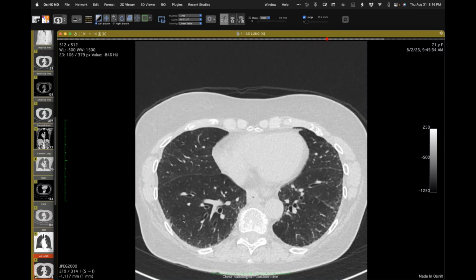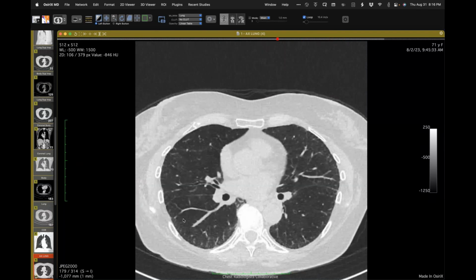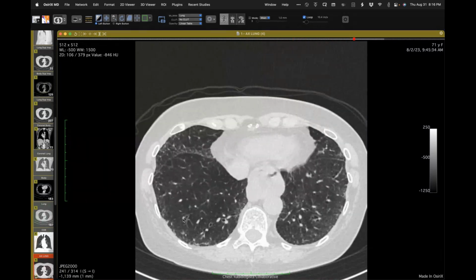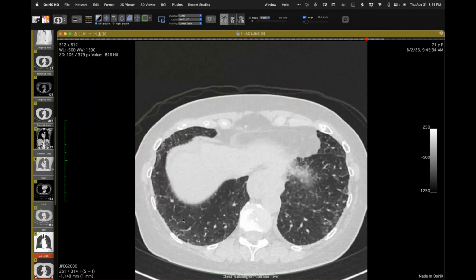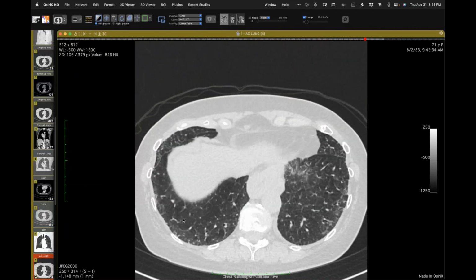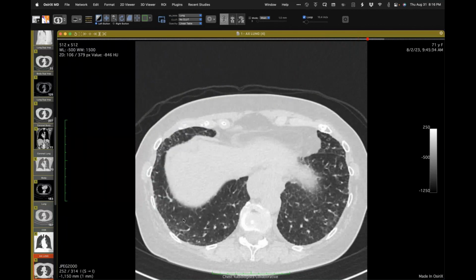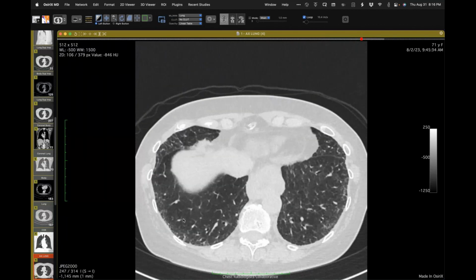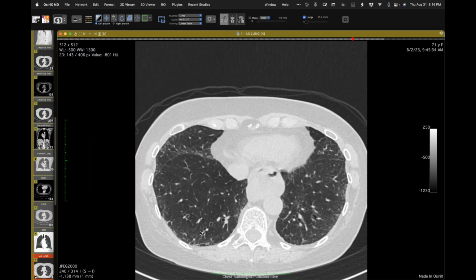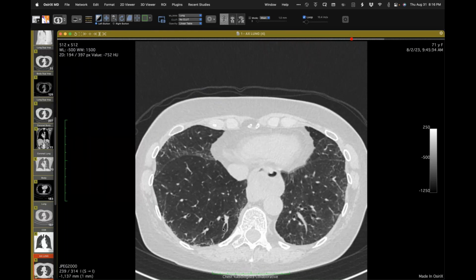I suspect this patient may be chronically aspirating as well because there's bronchiectasis in the lower lobes away from the fibrosis and that big hiatal hernia. Who knows how that plays in? But there's more than just traction bronchiectasis. If you go a little more centrally, those posterior basal bronchi are a little too big. Yeah, even further up. Very mild, it's very mild. So, but I don't think that accounts for everything.